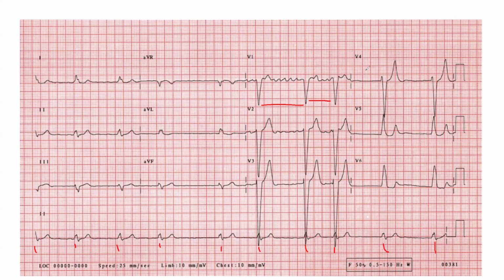Left click, and after you can use my cursor. It doesn't work. You cannot move my cursor? No, I don't think so. Okay, no problem. All right, so no P wave.